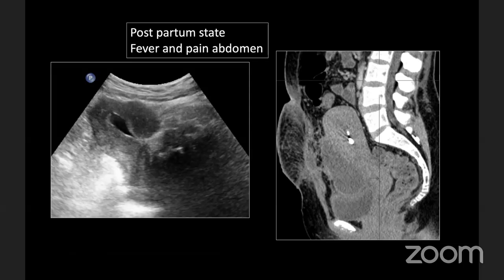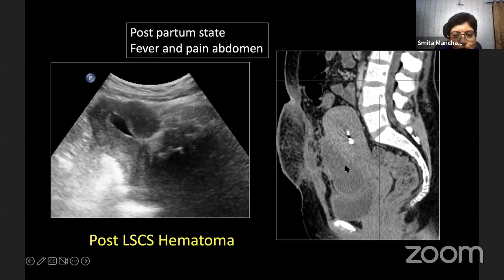Scar dehiscence, Dr. Prabha is saying dehiscence, scar dehiscence. Dr. Ayush, scar site abscess with endometritis, uterine rupture. Yes. 2 attendees, scar site infection, yes, with abscess. Yeah, so post-cesarean hematoma or abscess formation, yes. And for the scar site, actually, dehiscence would be the correct term. It is not really a rupture because we are still seeing the intact margin. So there is definitely a hematoma formation. Yes, it can be an infected hematoma or abscess. So that is also correct.